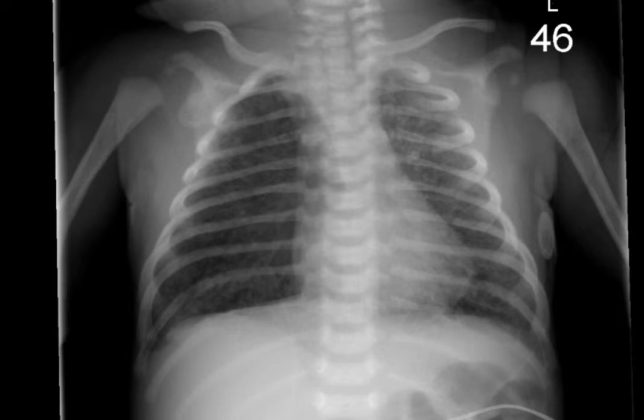This is a patient whose whole right hemithorax looks more lucent than the left side. There's no significant mediastinal shift here. There's no real asymmetric flattening of the diaphragms, but whenever you see a unilateral hyperlucent lung, always think of an anterior pneumothorax. It's possible in a patient like this that it could just be an overinflated right lung, either on a compensatory or obstructive basis. But whenever you see a unilateral hyperlucent hemithorax like this, you ought to just go ahead and get a decubitus film to rule out a pneumothorax.